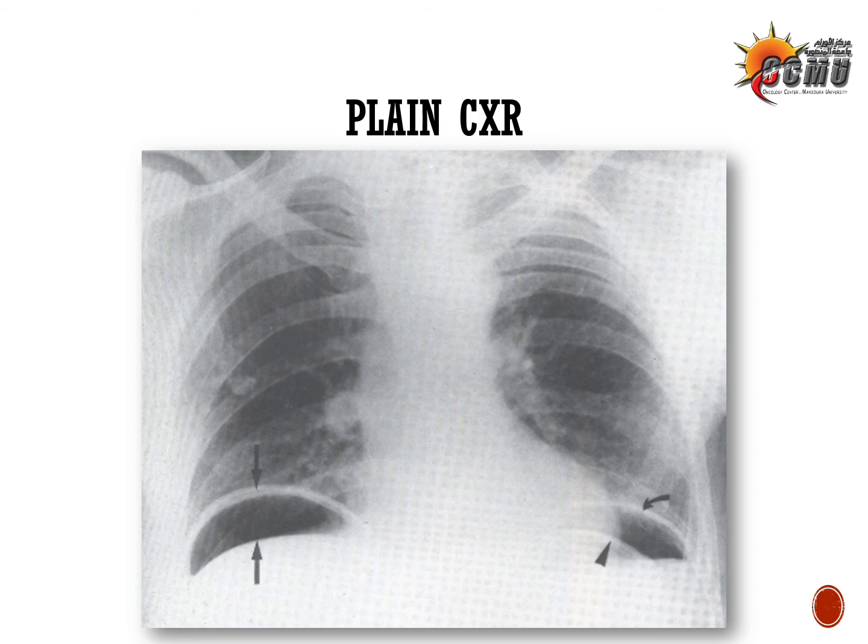showing the chest and the upper abdomen. It shows normally on the left side air inside the stomach, and on the right side that's abnormal. There is air under the right copula of the diaphragm.